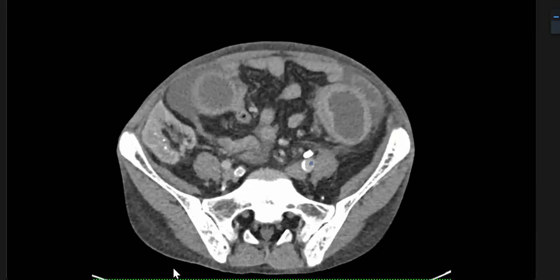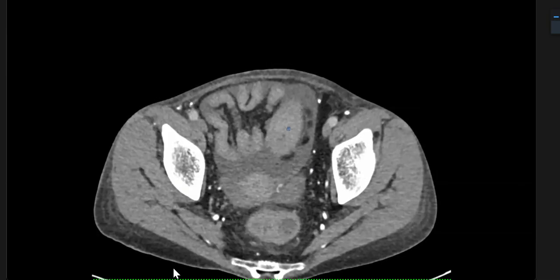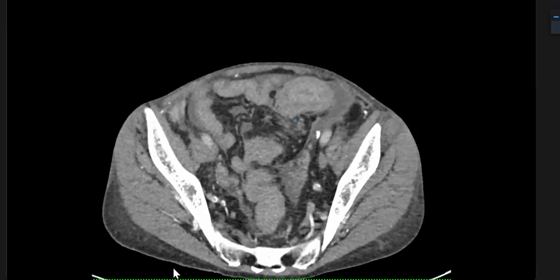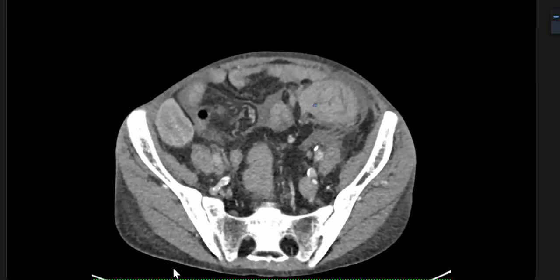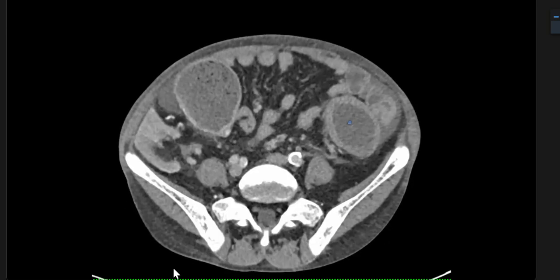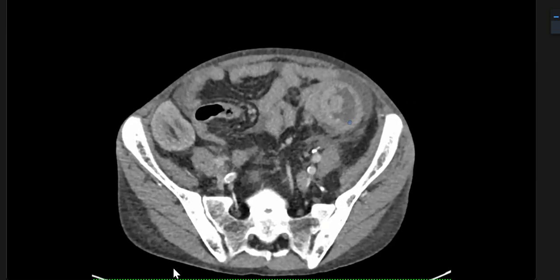So I would again like to go to the region of interest to look for the cause, to see for any underlying lesion, because there is an intussusception going on at the level of the sigmoid colon. But I'm not able to find the cause. However, okay, I would tell what is the final diagnosis? So the final diagnosis is colocolic intussusception at the level of the sigmoid colon, resulting in a massively dilated large bowel, which might result in imminent rupture, and the patient will urgently need a laparotomy. Okay, thank you. On the background of sickle cell disease.